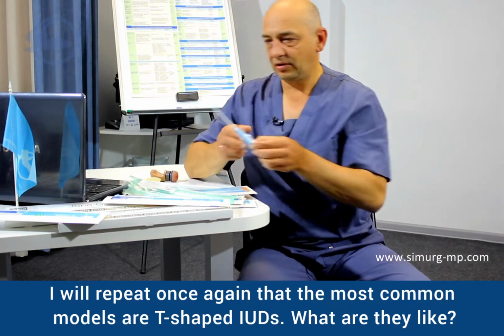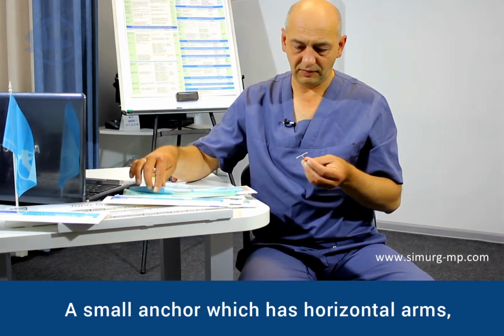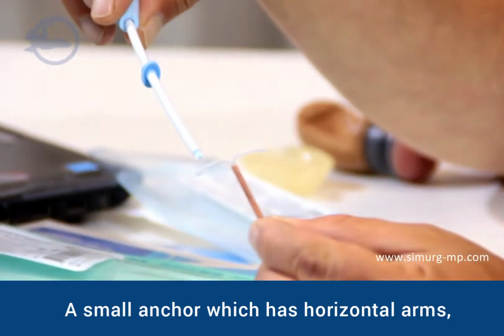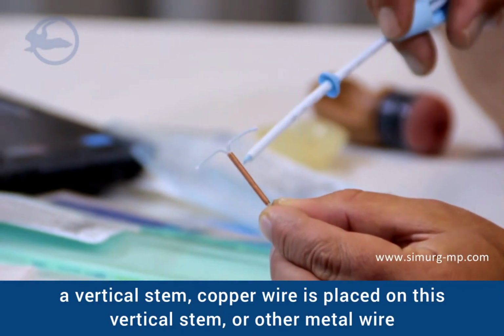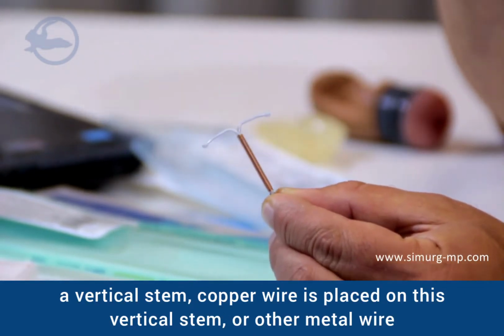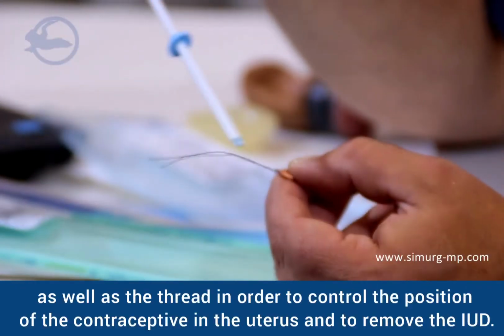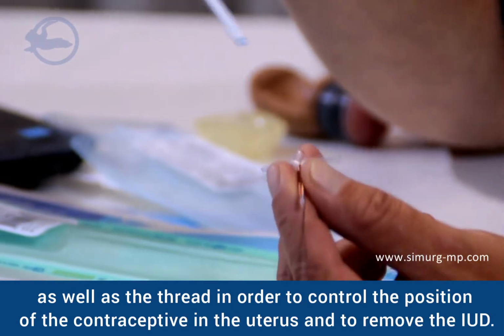What are they like? A small anchor which has horizontal arms, a vertical stem, copper wire is placed on this vertical stem or other metal wire, as well as the thread in order to control the position of the contraceptive in the uterus and to remove this IUD.